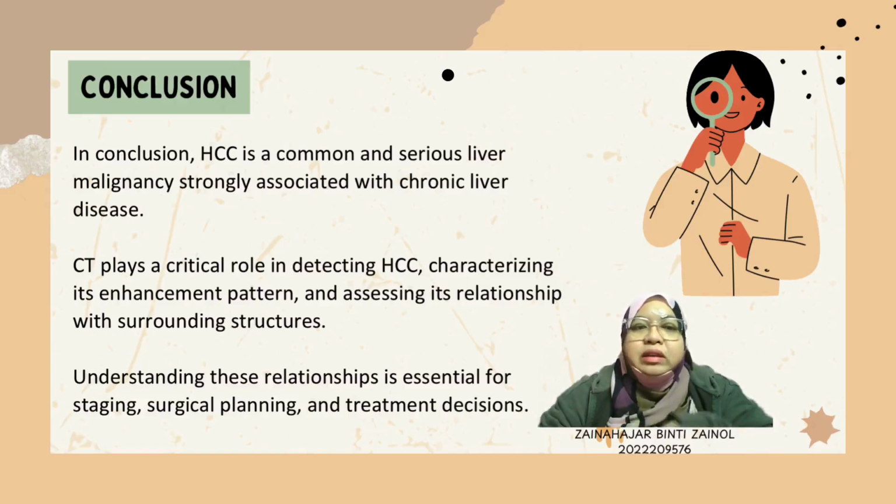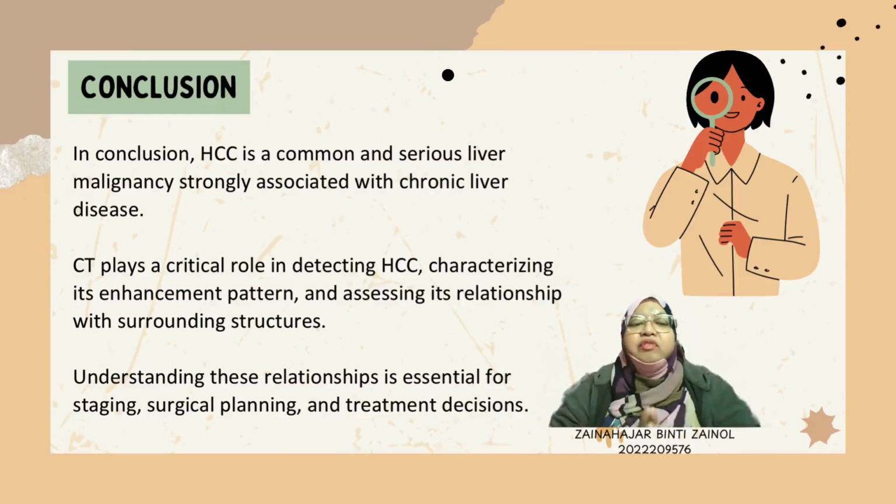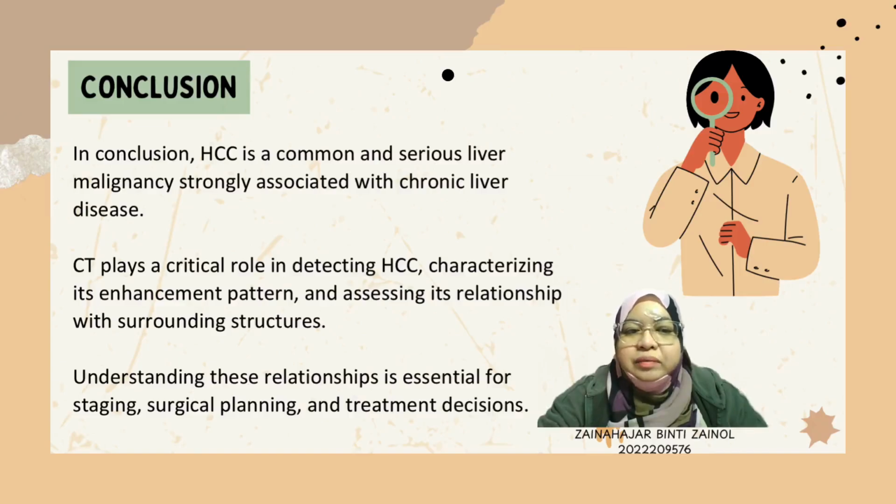CT imaging plays a critical role in the diagnosis and assessment of HCC. It helps us to detect the tumor based on its characteristic enhancement pattern, differentiate HCC from other liver lesions, and also evaluate any mass effect or vascular invasion.